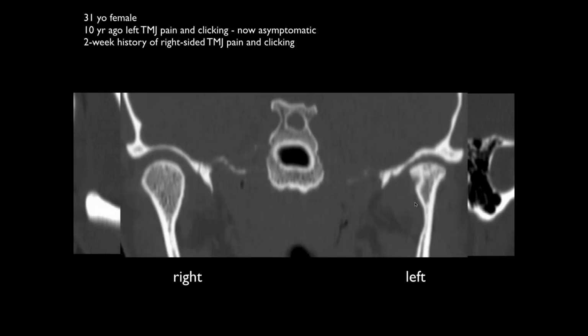What do you mean a little bit? Both sides are quite different. The right. Right, they are different. So what do you think is going on here? So let me think for a second. They used to have left side. So maybe the coronals.